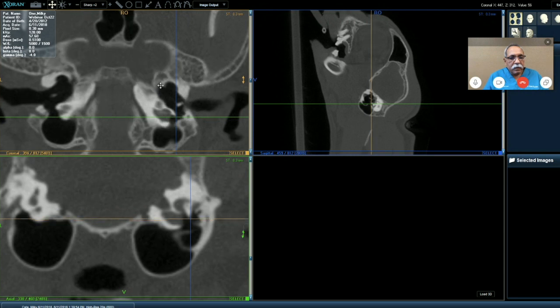Okay. On the left side, the round circle. No, where you were, where the semicircular. Go a little bit left, right there. That's the carotid artery right there. Okay, internal branch of carotid artery. Important branch, I suppose, to stay away from when you do a surgery. Absolutely, if you don't want to get into trouble. So it doesn't take much. It's right behind the chain. Very delicate area. Okay, that's a very interesting case.